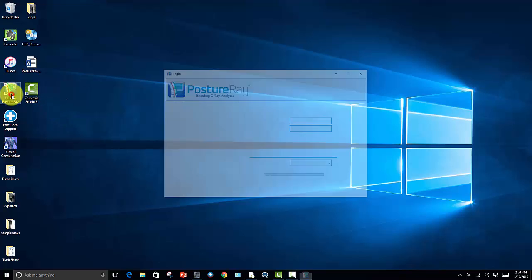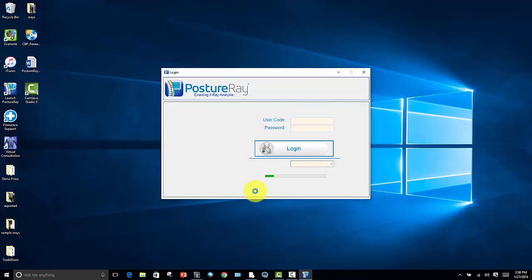Okay, in this training video, we're going to go start to finish with PostureRay, and we're going to do just a lateral cervical and AP cervical, bringing it in. A couple things. We have individual training videos on every single topic that are more in depth. This is just a quick start to finish after PostureRay has already been set up.